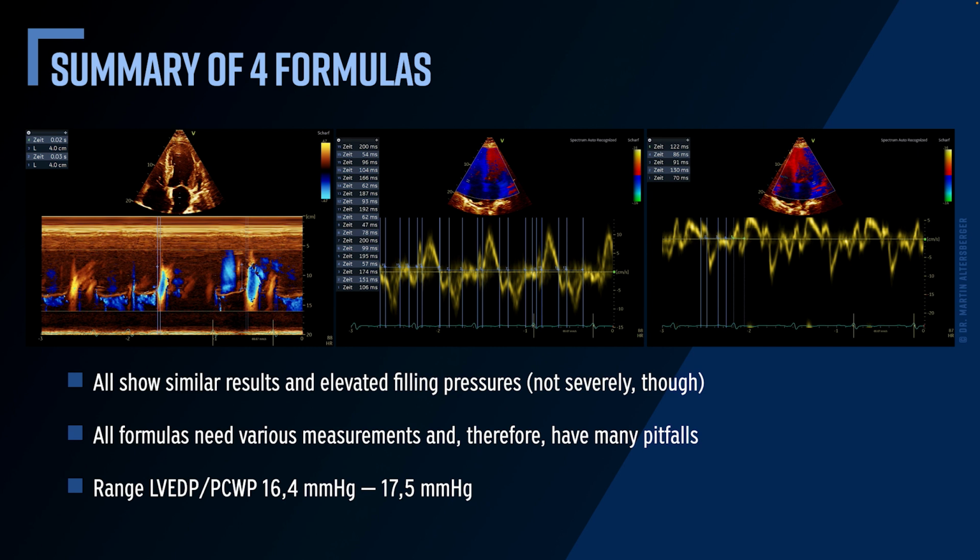Furthermore, all the formulas need various measurements and therefore have many pitfalls, especially when you have time intervals and not optimal visualizations of the signal. So if you have a suboptimal TDI, it's definitely a pitfall if you cannot differentiate the IVRT properly.